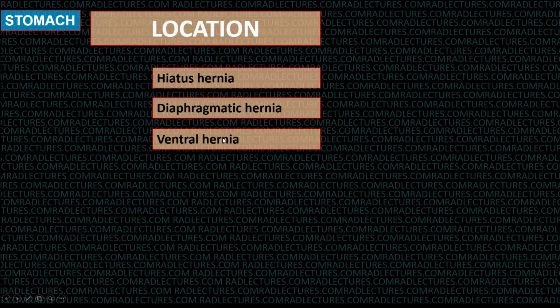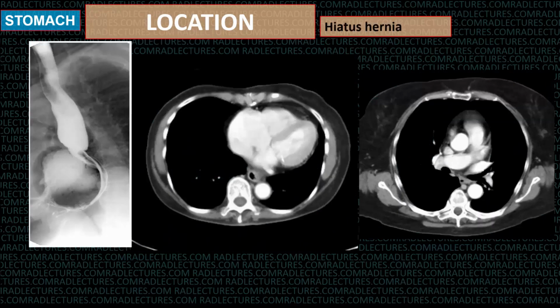This is rare for the stomach; it's mostly the bowel loops, but hiatus hernias are very common. Apart from that, the stomach may be displaced by a mass or fluid collection or an enlarged organ in the body. All those cause an abnormal location.